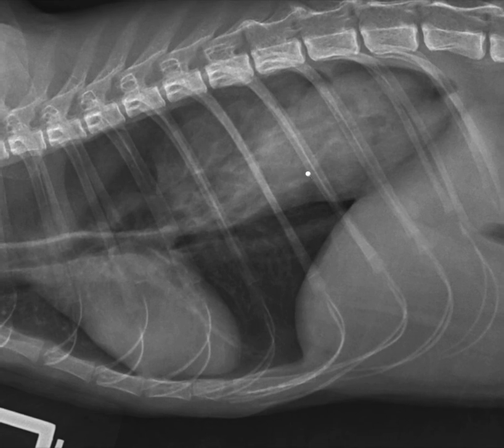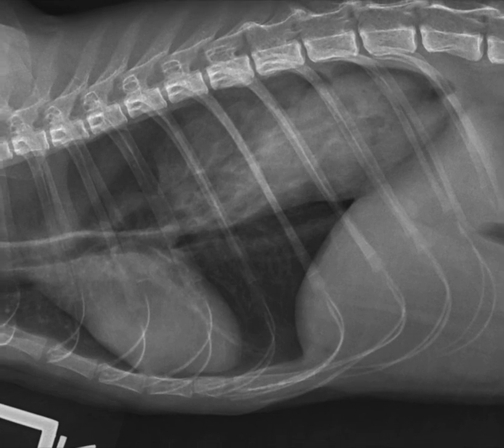The next thing I want to talk about while we have this view open in particular is the concept of margination. Look at how well defined the edges of this are next to this gas opacity. This structure being so well defined on the cranial margin makes me quite certain that it's surrounded by gas and that that gas soft tissue interface is creating a clear margination.